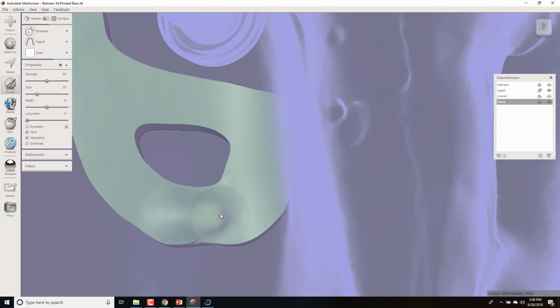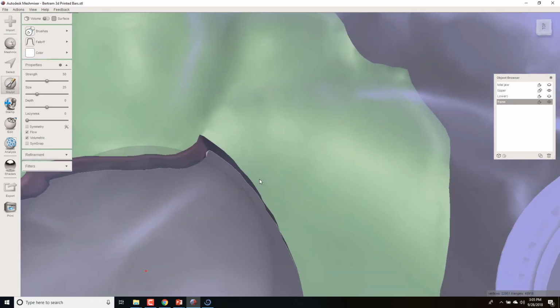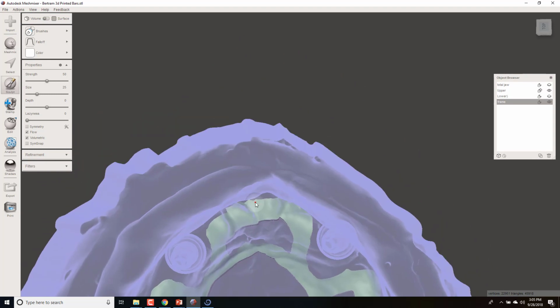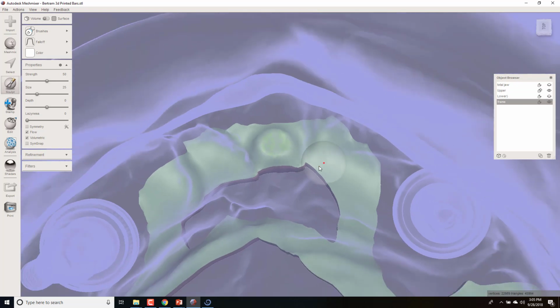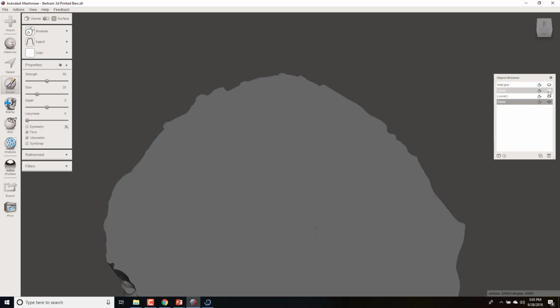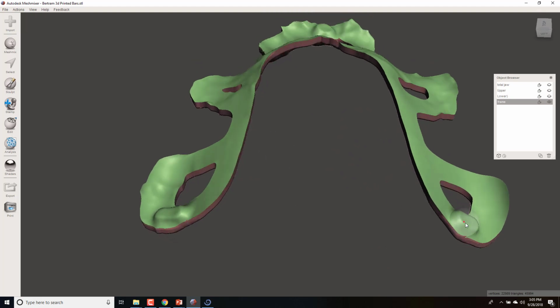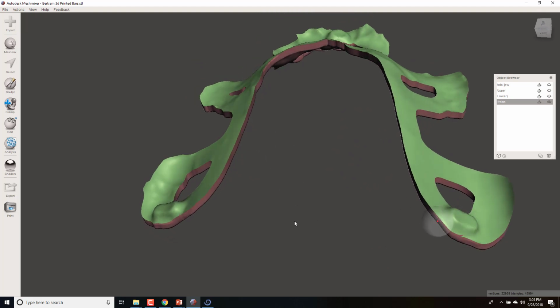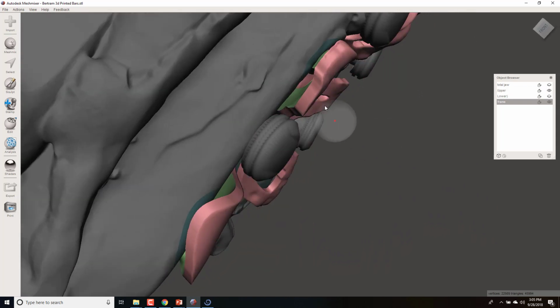Use your attract tool. Right there it just ran into the model, and now I have that portion and I just need an anterior stop to the tripod. We'll go up here to maybe the region of the incised papilla and just repeat the process. So now we have 3 tissue stops on this model, and I can turn off the attract tool and look at this now, and you can see these 3 tissue stops. So everywhere except for right here, here, and here, there's going to be 1 millimeter of space between this framework.